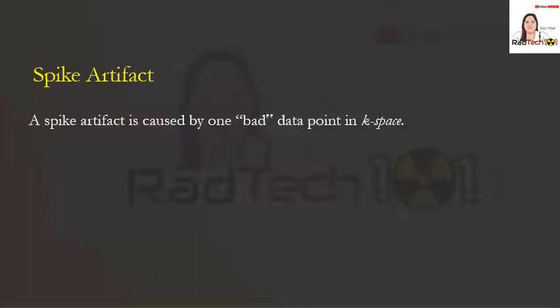Next, we have the spike artifact, which is caused by one bad data point in k-space. So yung k-space na na-discuss natin sa previous na video, kapag magkaroon doon ng isang bad line or may isang konting error lang, magkakaroon siya ng spike artifact. Diba sabi ko nga, parang mini-mirror niya lang yung sa kabilang side para mas mabilis yung pag-scan. So, ipaprocess din niya yung error na yon, i-reflect din niya dun sa kabilang side.